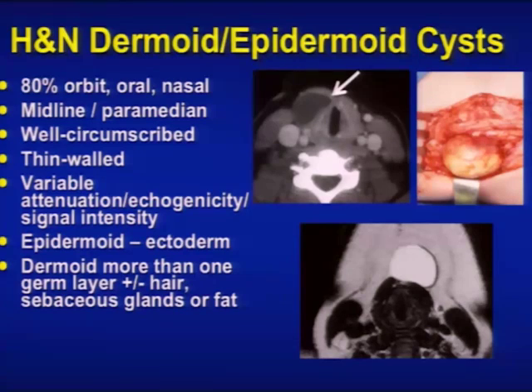So here we have a kid with a lesion sort of buried in the strap muscles, but it's off midline, it's coming towards the midline. Is that a thyroglossal duct cyst that's off midline or a dermoid cyst? Turns out to be a dermoid cyst. And another one with a hyperintense T2 signal midline mass in a patient with an epidermoid.